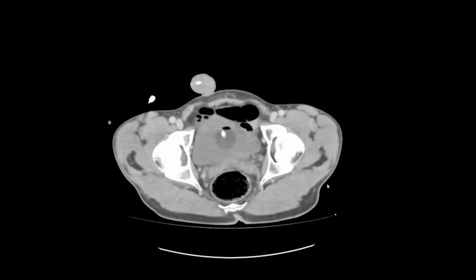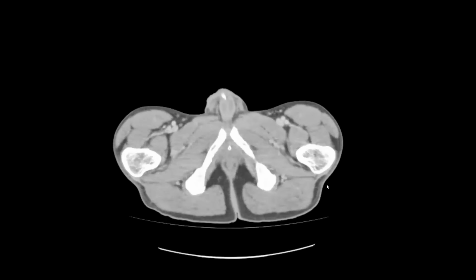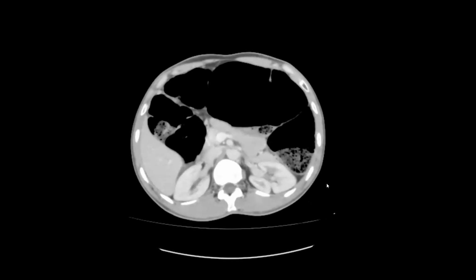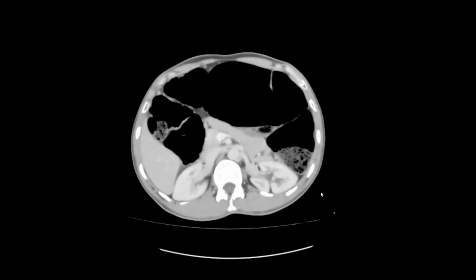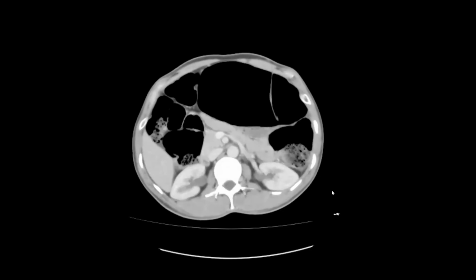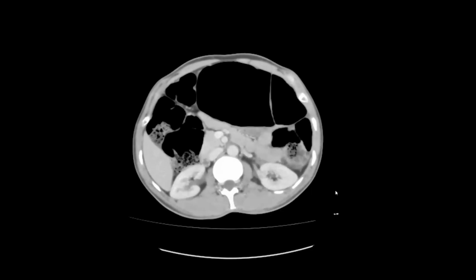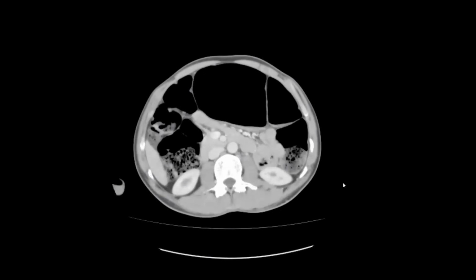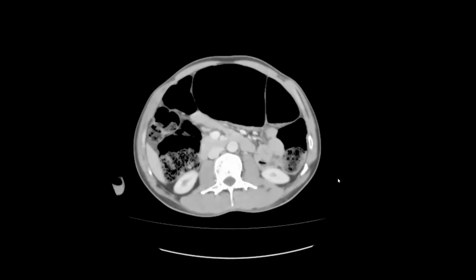It's just going quickly, starting from the upper cuts going down. You see, I have deliberately put in the thickened cuts because in the exam they used to put thick cuts which are going to scroll very quickly. So just be patient while you are scrolling, okay? Starting from this cut, I can see there is marked bowel dilatation seen on the periphery of the abdomen, denoting large bowel obstruction.